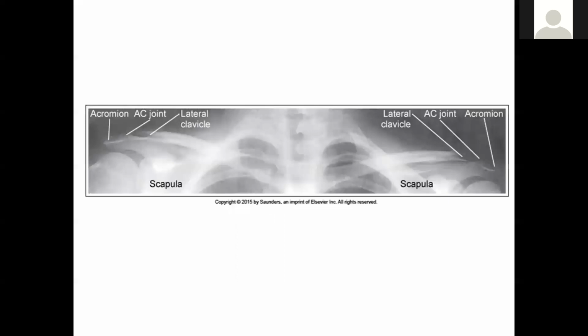For acromioclavicular joints, this is a rarer exam, but fairly simple to do. Typically 2 projections based on what your patient is capable of doing. This is a bilateral exam. Your department protocols usually will not have left AC joint or right AC joint. The radiologist will want to see both. So it's essentially positioned similar to a clavicle series, except you're getting both sides.